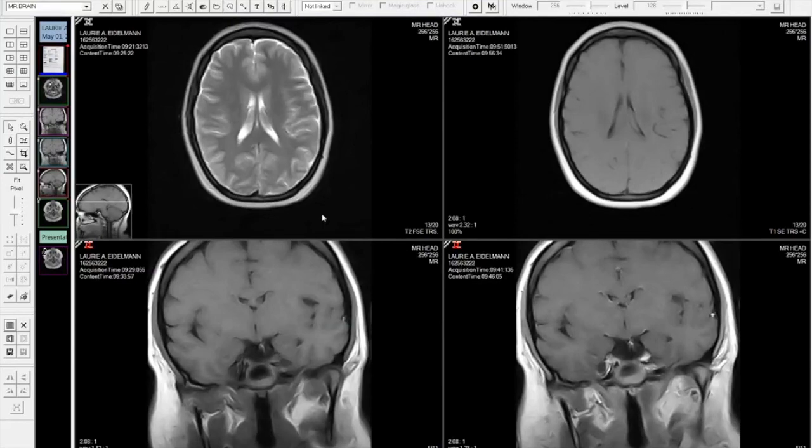So we've only burned about a half an hour, but we've shown some reasonable complexity. We've looked at individual hanging protocols for current and prior exams displayed as opposed to individual exams. The system recognizes the difference.